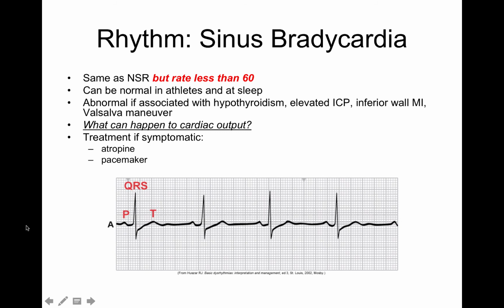Keep in mind as we're looking at EKG rhythms here, it's really important to know that this is only indicating electrical activity. This is not correlating any mechanical capture. How you identify mechanical capture is feeling for a pulse. At the top of every R wave is where you should be able to feel a pulse.